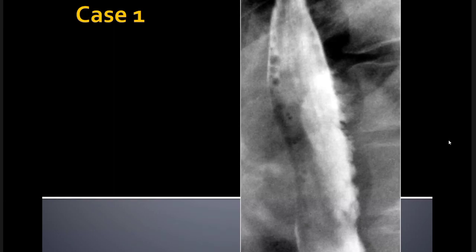I would say it's going a bit long way. I'm thinking of the glands that get filled up with barium. Yeah, I agree with you. I think the barium is going quite deep into the wall, isn't it? Yes. Like for instance, this area here, you see the edge of that barium is kind of sticking all the way out here. So if I tell you that there are deep ulcers, does that change your differential?